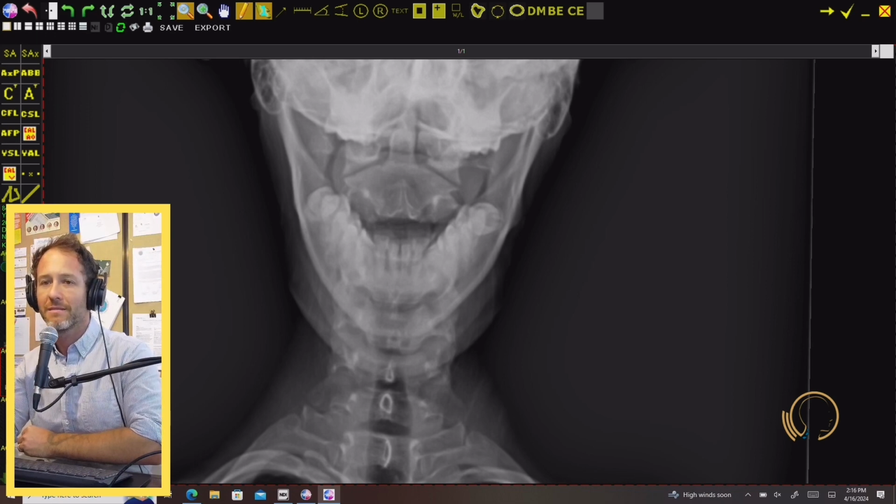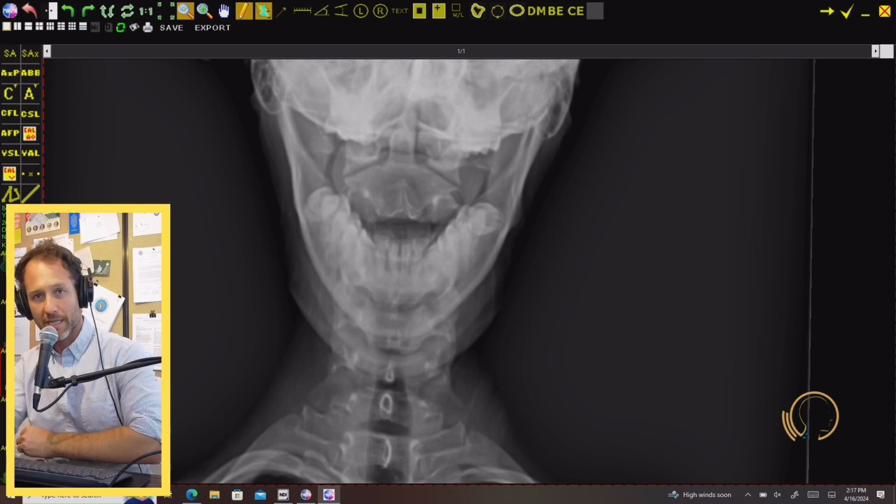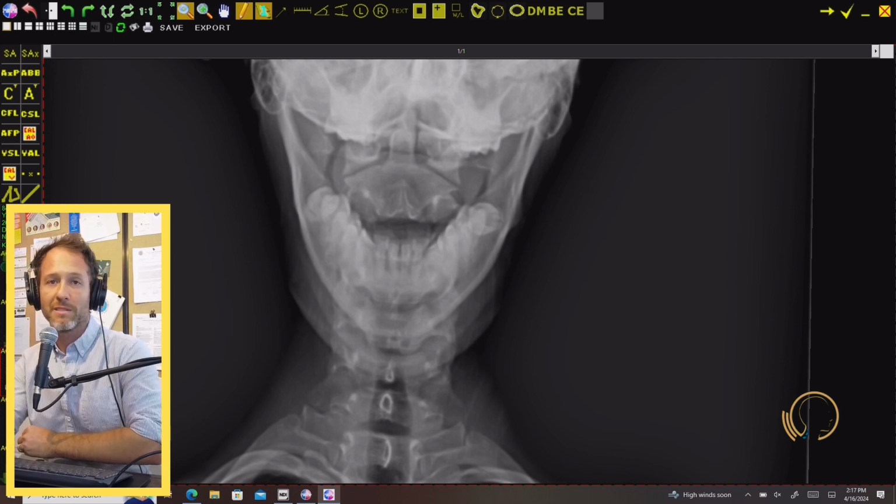And when I say that, what am I talking about, right? Well, the height that you set the instrument head up on is greatly influenced by the measurement of the axial circle, the C over A. So the condylar circle. And again, frontal film analysis, check out that video for more information on that. But then the measurement of the axial circle from this axial view is going to give you the tools to determine that C over A measurement, which is what determines primarily the height that you're adjusting somebody on.